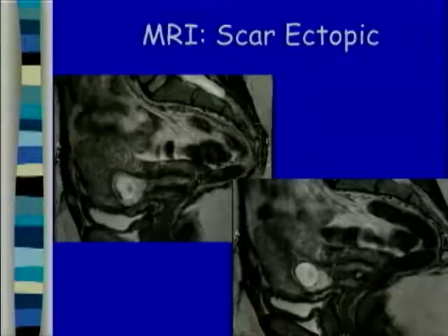And here you can see the endometrium, and there's the ectopic. So I think, in your first case or two, you may feel like MR would help to confirm exactly where this ectopic is. You want to differentiate it from a cervical ectopic, or the other main thing is just an abortion in progress.